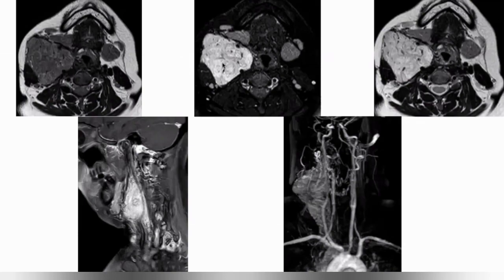So paragangliomas are very vascular tumors, number one. And number two, in the books we see there has been description of a salt and pepper appearance. So we do see that appearance sometimes. Salt is basically hemorrhage on the T1 weighted images showing hyperintense signal, and pepper is basically flow voids on the T2 weighted images. So we can see some flow voids on this T2 weighted image. These are showing vessels in the tumor, and maybe there are some hemorrhagic areas, and these are showing hyperintense areas on the plain T1 weighted image.